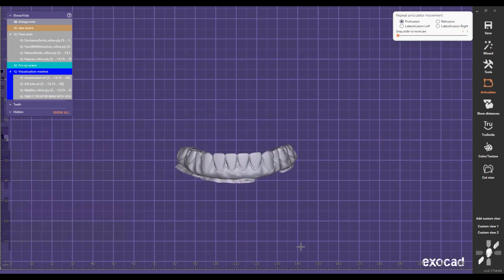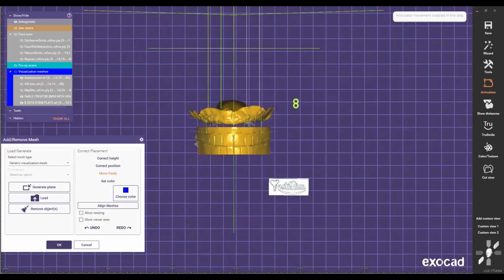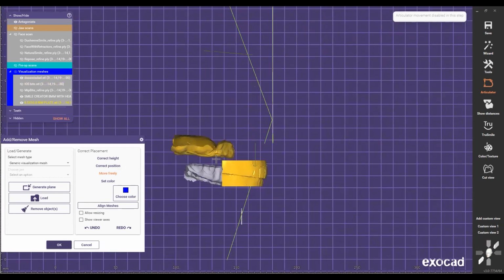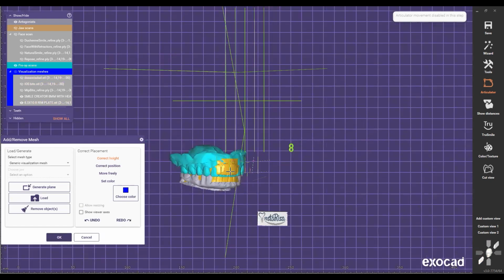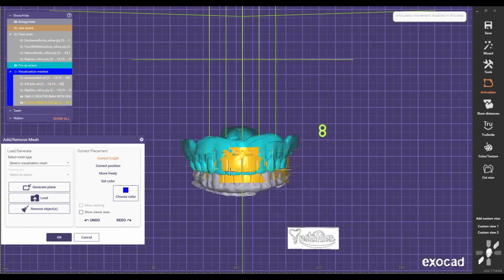And also when I'm doing my double arches, I like to use wax trims. Wax trims are basically STLs that I developed that I just bring in and start using like that. And for single arches, I don't really use them much because it's not a big deal to make a single arch. So then I just slide it based on my pre-op, and then I just go by height, because you have to think digitally. You have to always see what's out there in the analog world, and then you just convert it into digital.